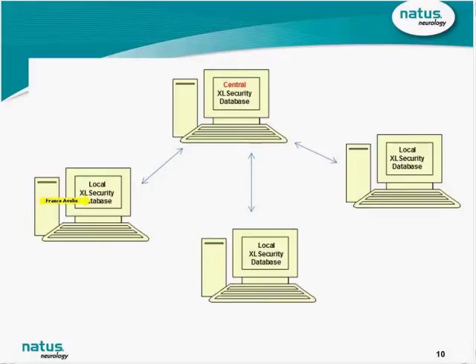Now, how often do the computers communicate with each other? Every time a user logs onto the system, a synchronization process occurs between the computer and wherever the central XLSecurity database is stored, whether it's a server or just another machine.